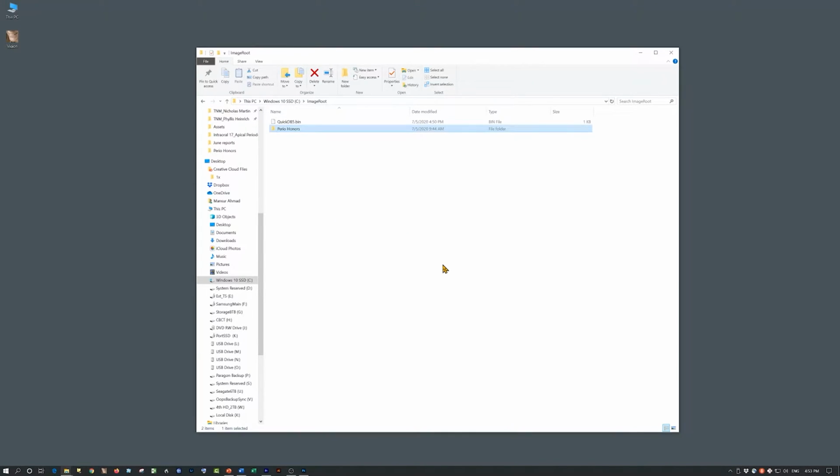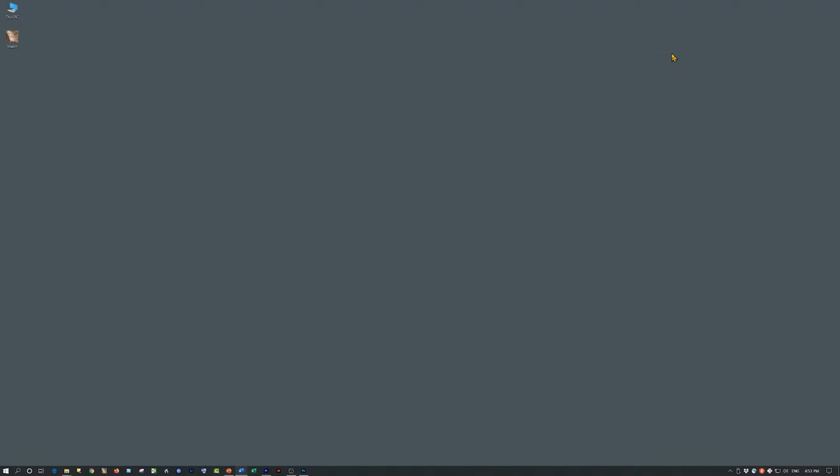In the future, whenever you receive a CD from the radiology clinic, you will look for the DICOM folder in the CD. Then you will drag the DICOM folder to this image root. It is always faster to view a DICOM folder from a hard disk than a CD. So let's close this and open iCATVision again. Click No. There's no new software.